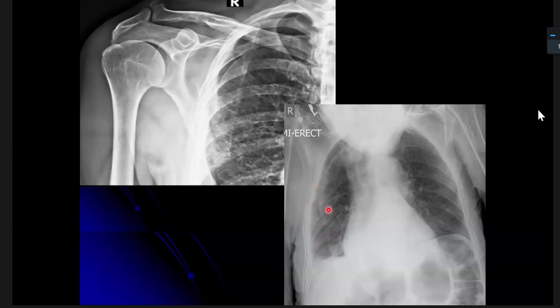And the most important feature: look at these bronchovascular markings. They are so neatly seen. In the presence of true pneumothorax, we should expect absence of the bronchovascular markings, which is the most specific sign. So when you interpret a pneumothorax on day-to-day ICU X-rays, always see that it is not crossing the chest wall. Here there are prominent bronchovascular markings beyond what we are seeing along the chest X-ray. So this is nothing but a skin fold.